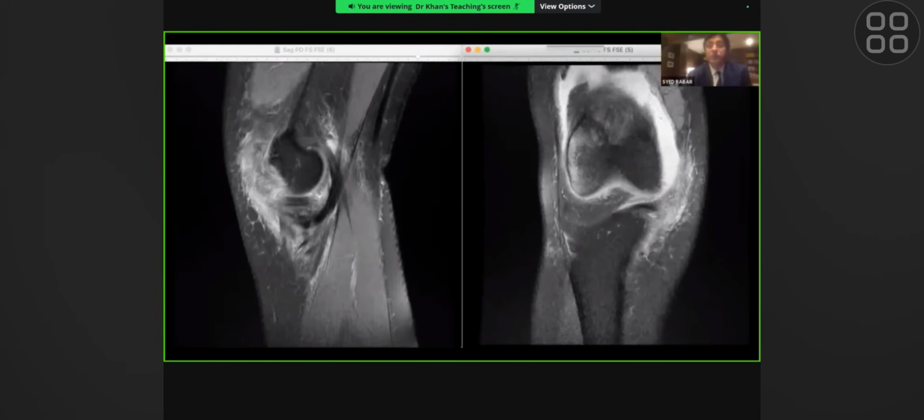Okay, so we'll take the remote control back. Well done. So in summary, it was a dashboard injury with rupture of the PCL. So good, you did very well in the sense that you quickly picked up the things that I've just noted on the previous MR. So you're going through the same routine, which is excellent.